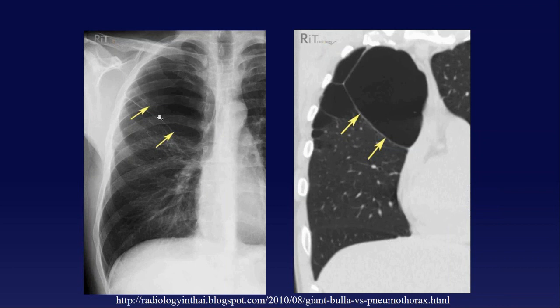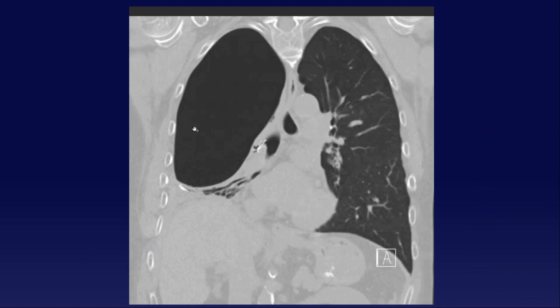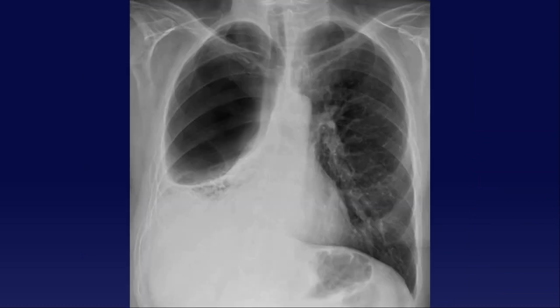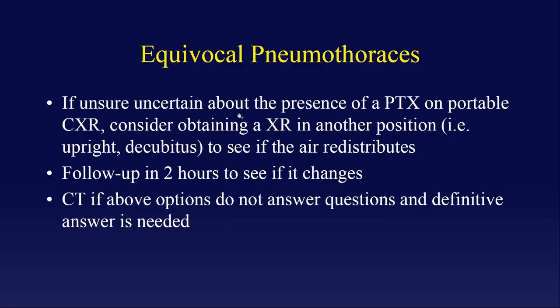If there's ever a question, call radiology and ask. But like I said, this does not follow the normal expected contour of the pleura. If there's ever a question, just call radiology. Say, hey, I think that's a bulla. What do you think? And then take it from there. Yeah, this one's pretty hard. I think this is just a big giant bulla or something like that. Either that or, every once in a while, post-surgical patients get pneumos that just hang around for a while, and it's really weird. Like, do you have a chronic air leak, but they're stable and they just kind of live like that?